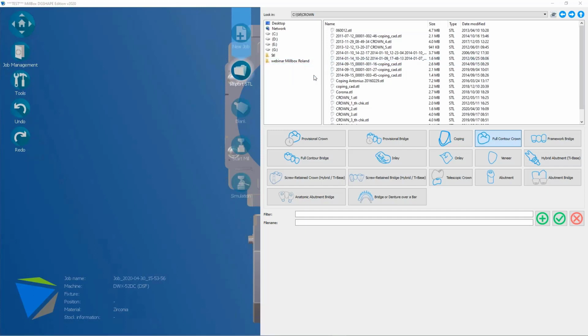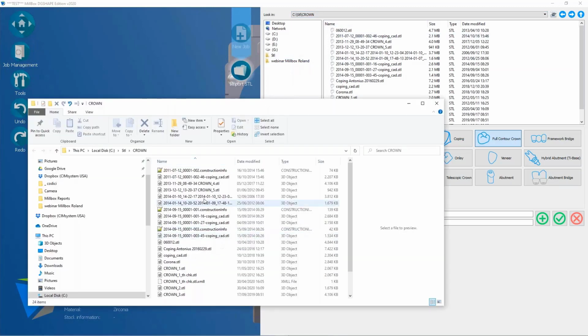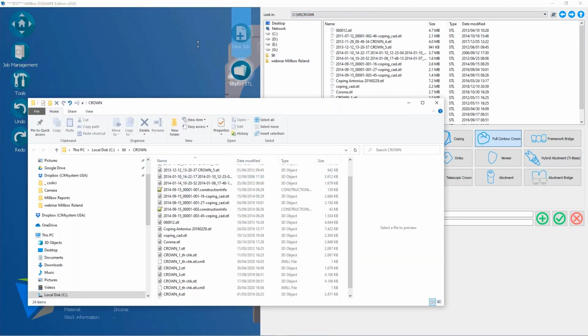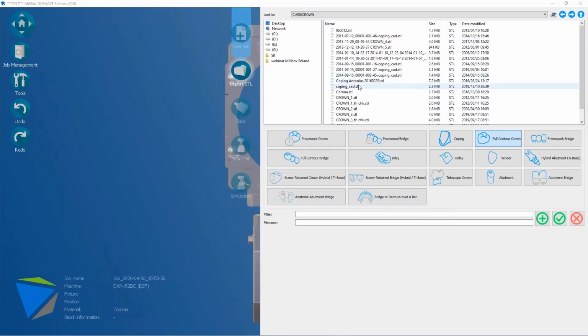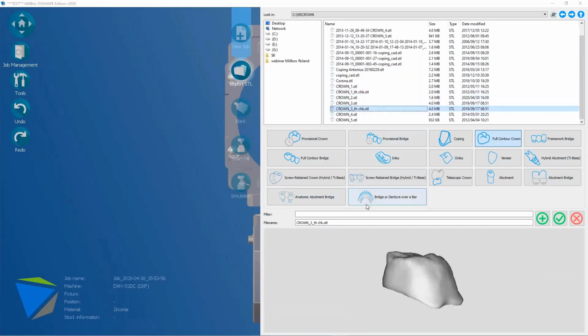Of course, you can even remove it in case you don't want it. Of course, also with the right mouse button, you can just open with the Explorer to open the folder directly and see the complete content by using the Windows Explorer. Okay, so you can check it.